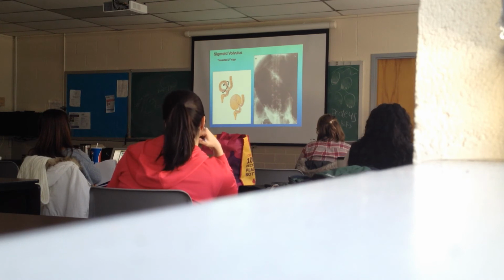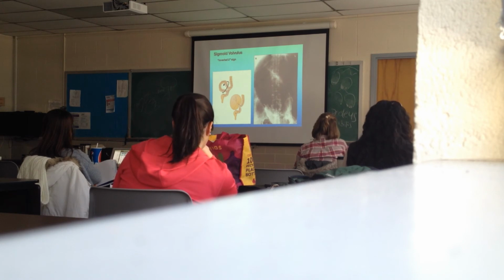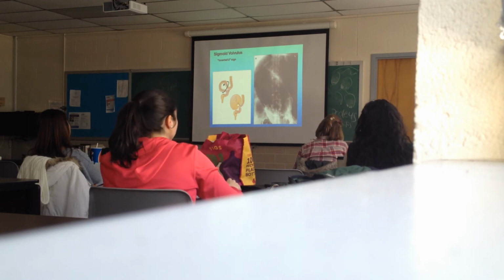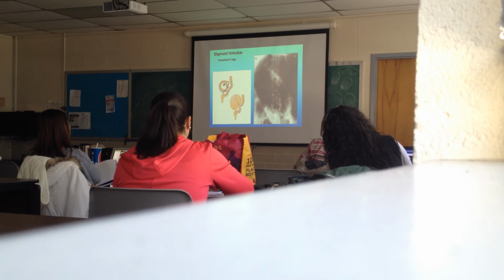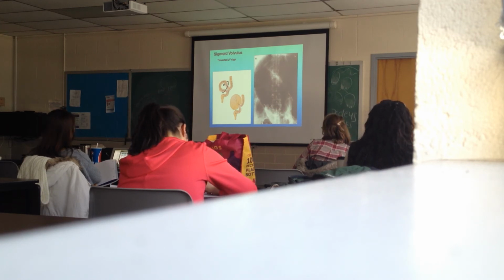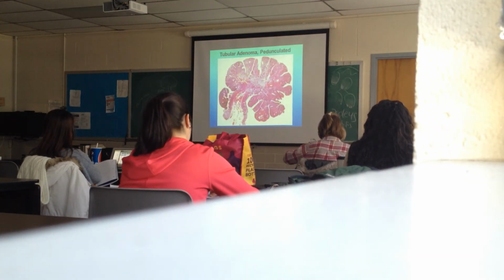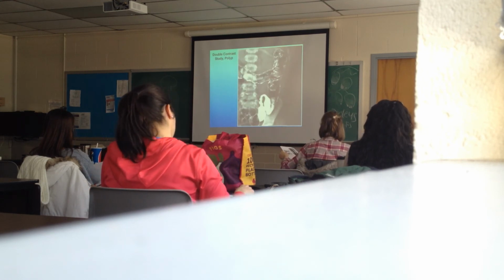Okay, that's not the best example of a volvulus, but it's called the inverted U sign. You're looking at a radiograph. There is a loop of bowel twisted on its base. There's the base, there's the bowel over there. You can't see the whole inverted U, but it's called the inverted U sign. Not a good example. Okay. Can you recognize a double contrast study when you see it?